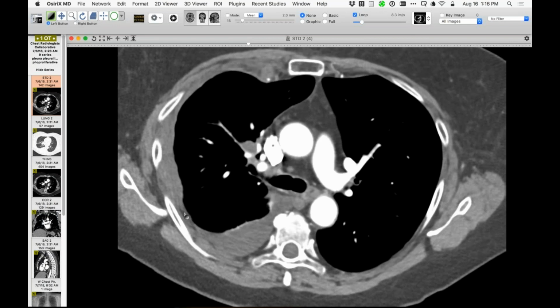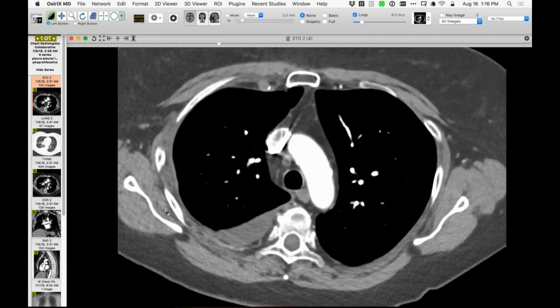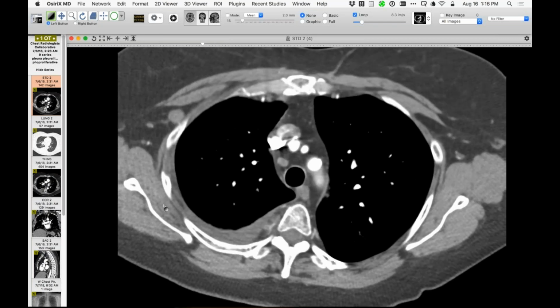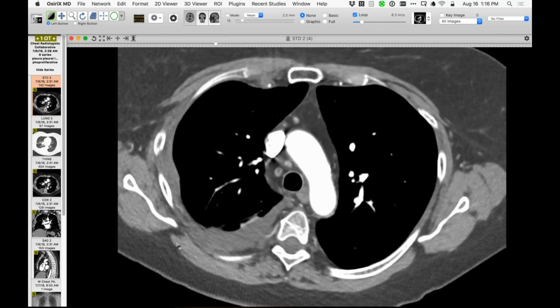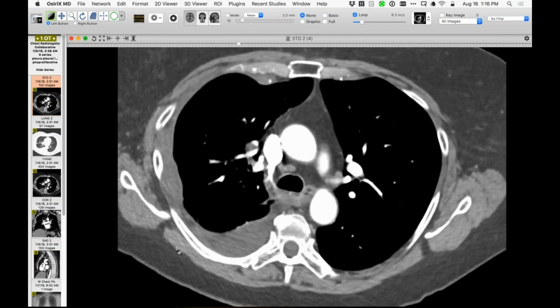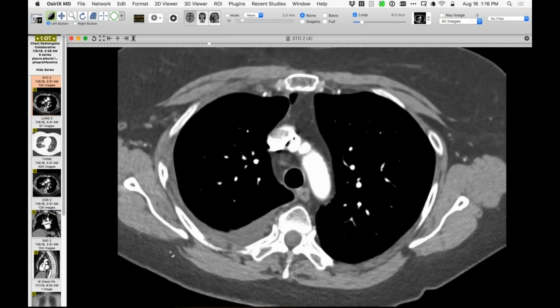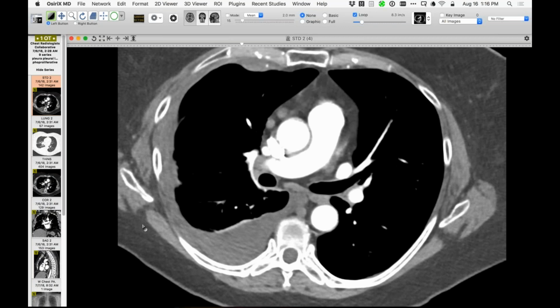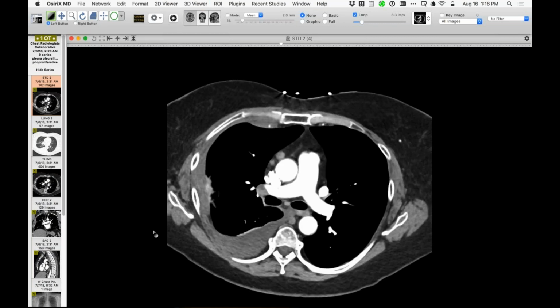That indicates that external to the displaced fat here, and it's subtle, the tissue here is extrapleural. And then you see that a little bit more up higher. But this tissue here is not that of just plain fluid, and we have the extrapleural fat sign. That indicates that the pleura here is very abnormal. It's thickened by tissue. So we have that finding.